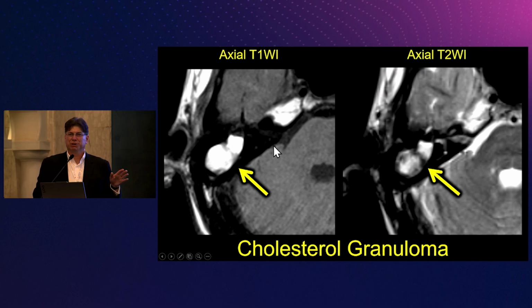Not a lot of things are bright on T1, so we have to put in one of those categories. Is it fat? Is it proteinaceous material? We talk about melanotic, bright T1 signal. If somebody has melanoma, we sometimes talk about melanotic and amelanotic types of melanoma. So not a lot of things are bright. If we do fat saturation and it stays bright, I know it's not fat. If I haven't given gadolinium yet, I know it's not an enhancing lesion.